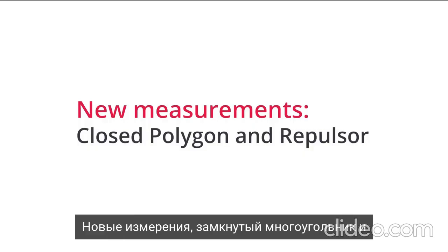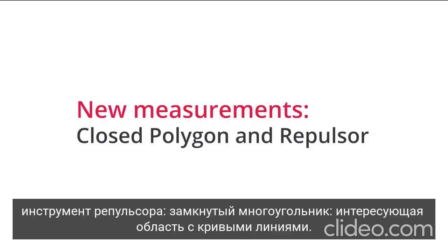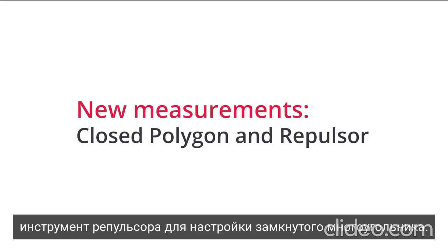New measurements, Closed Polygon and Repulsor tool. Closed Polygon, the region of interest with curved lines. Repulsor tool for adjusting closed polygon.